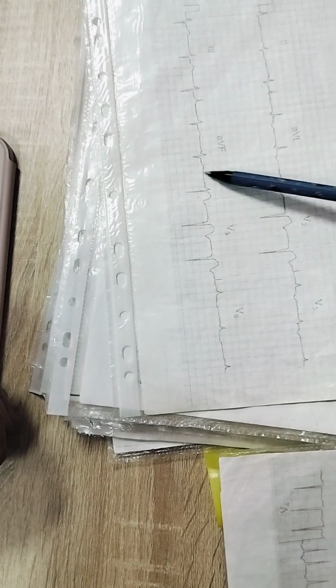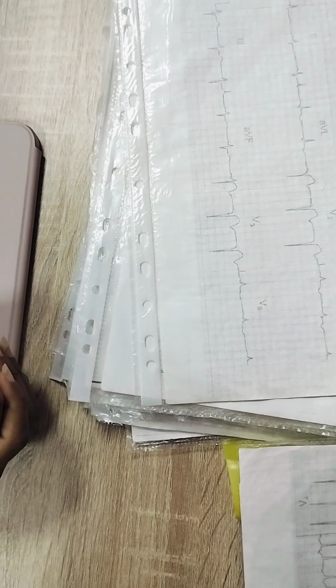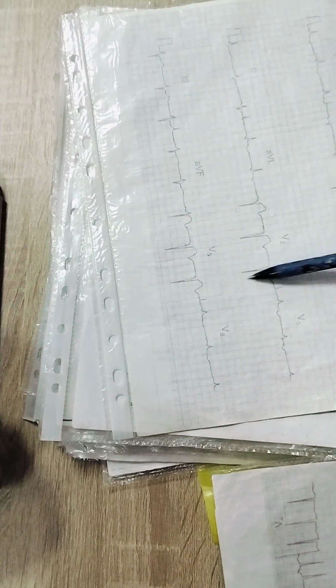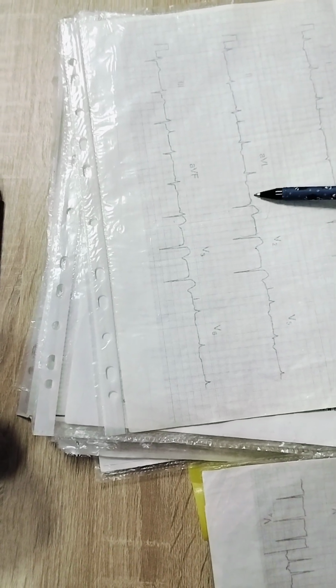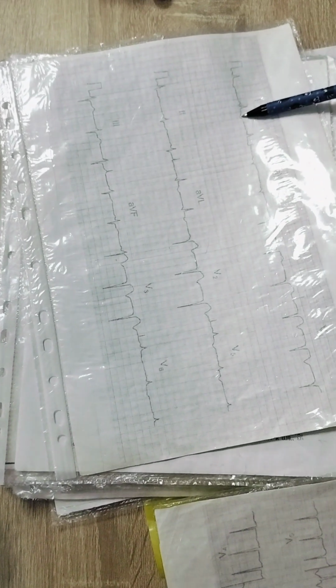In this case, it's because of right parts of the heart. It's left ventricle, but right parts of the left ventricle have a myocardial infarction. That's why electrical axis is changed. Why myocardial infarction? In these leads, T wave is negative. It's abnormal case.